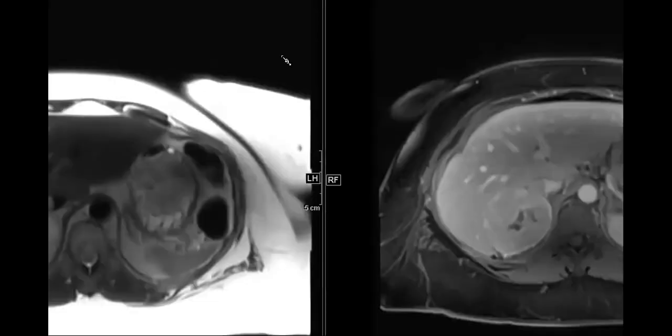Actually, the person who read this didn't have access to the initial CT to see that it had decreased in size and all this stuff. So they were very concerned about this, and thought it may be a neuroendocrine met, et cetera. I would say it's even more restricting than most malignant lesions. So it's like, wait, something weird is going on here. But that was definitely a pitfall.